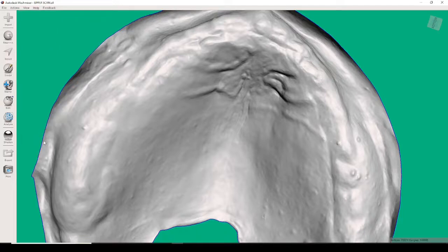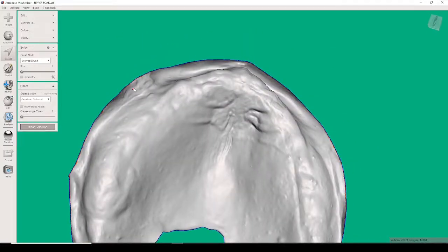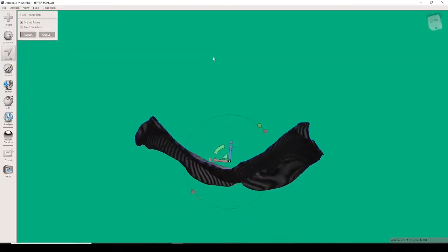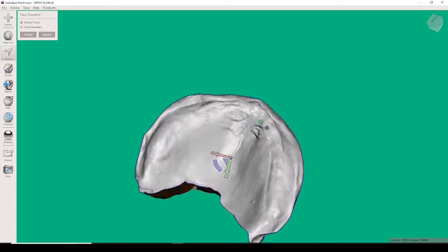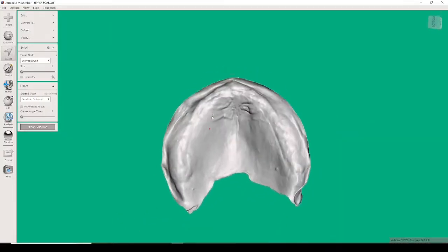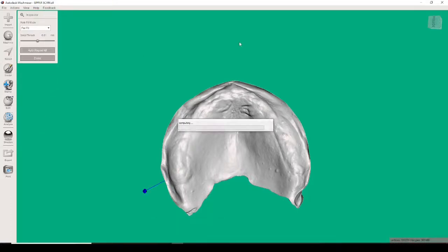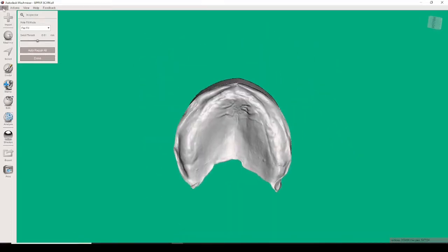So what I'm doing now is I'm selecting just the edge. In order to do that, you need to make your brush size at 0 and click right on the edge, and then you switch to transform, and that way, by going down, you create a base. And you see right here, you can tell that there are no holes in the base because I've cut the sides of the model properly. Okay, so from this point we just have a hole at the very bottom, as you can see right there, and I'm going to spend a little bit of time filling that hole in. I actually fast forwarded the video a little bit here because it takes a little bit of time to do that in the Mesh Mixer.